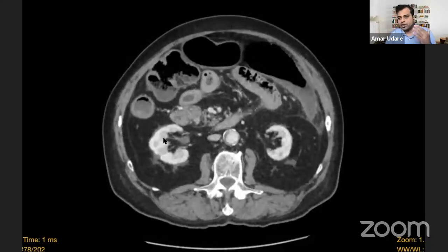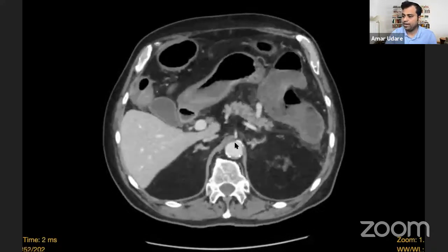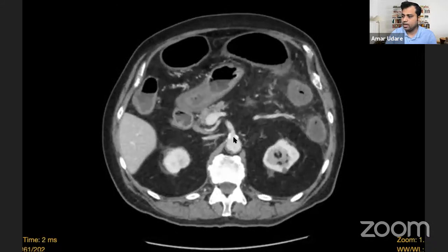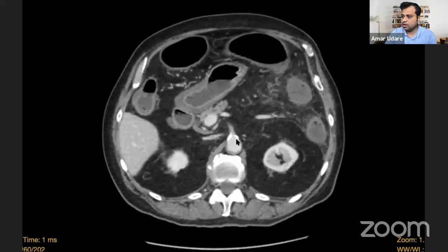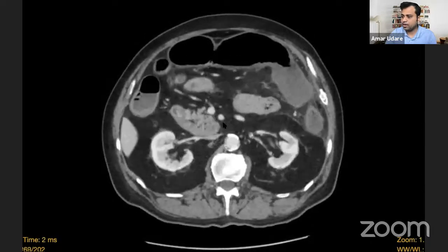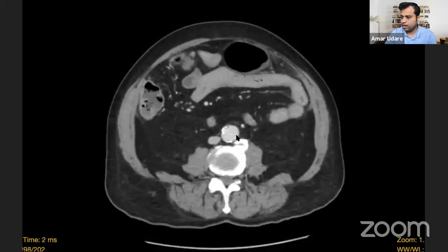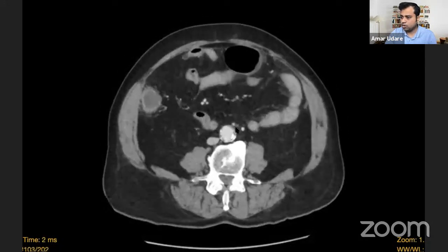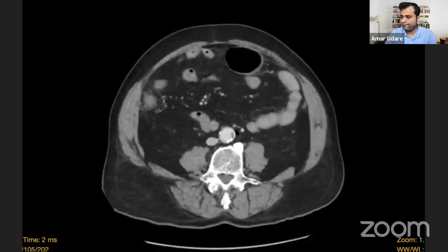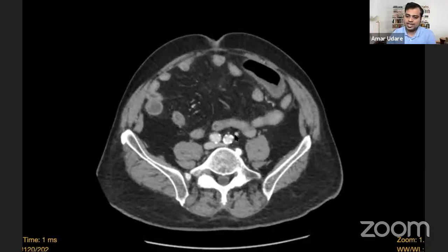The most common type of acute mesenteric ischemia is arterial. So whenever you see bowel ischemia, go back and look at your main vessel. So in this case, let's look at the SMA and IMA. The SMA here, there is a plaque sitting here, but the major branches look patent. Let's look at the IMA. Even the IMA and its branches, although they're very small, I don't see a frank thrombus in this case. So this is non-occlusive mesenteric ischemia.